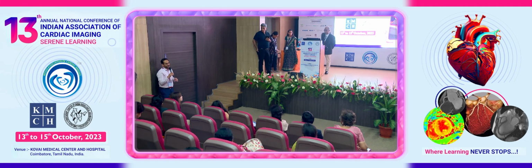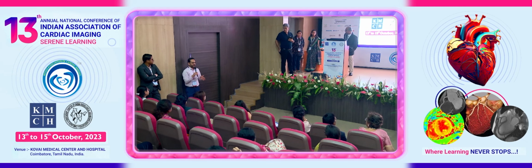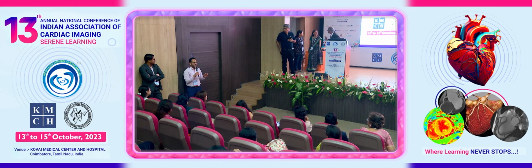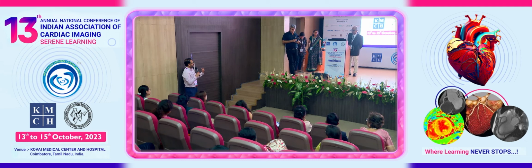So when we do RVOT assessment for transcatheter pulmonic valve placement, we provide systolic as well as diastolic images, and the measurements that we include are both systole and diastole of RVOT, pulmonic annulus, main PA, right PA, and left PA. With regards to the coronary relation, it is pertinent because every interventional cardiologist is going to start by placing a balloon at that site.